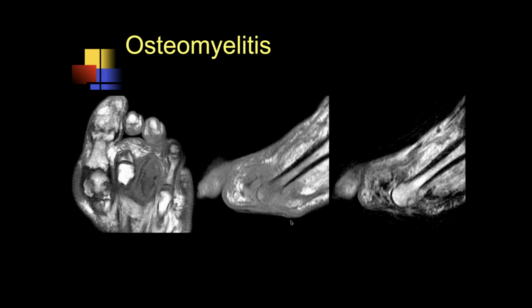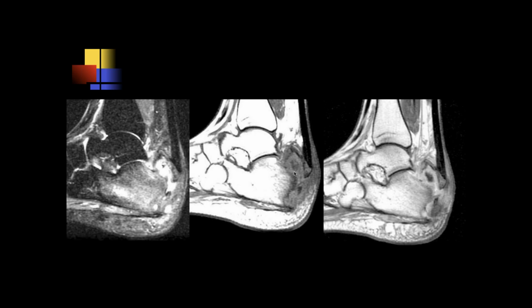osteomyelitis. Yeah, that's exactly what this was, and there was an ulcer here, and this was a direct extension of infection into the soft tissues at the ulcer into the distal third metatarsal head, and very typical of how osteomyelitis can start out, especially in diabetics in this area.